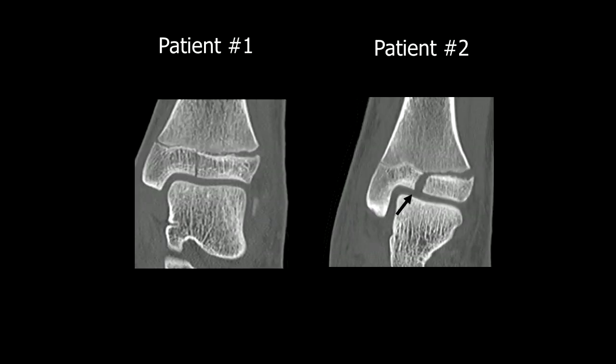Now, often these children may undergo CT imaging to evaluate the extent of distraction or step-off at the articular surface, with the rough guideline of approximately 2 millimeters being the difference between closed fixation or possible intraoperative intervention. Patient on the left shows no substantial displacement, whereas the patient on the right had greater than 2 millimeters of displacement, which brought him an intraoperative reduction and casting.